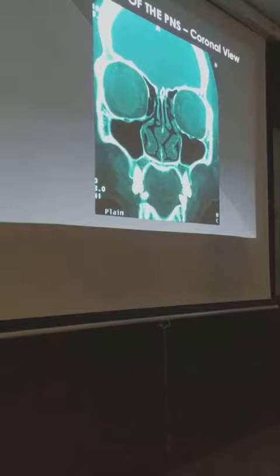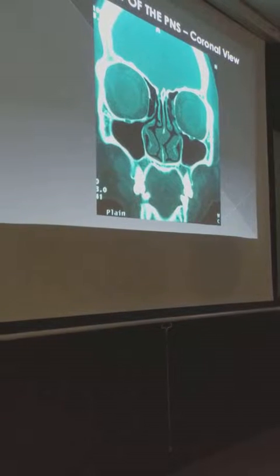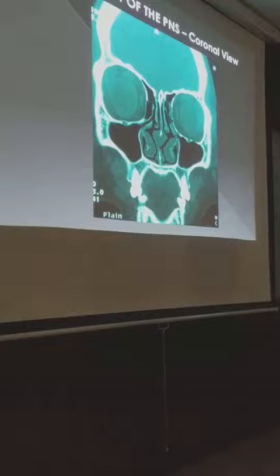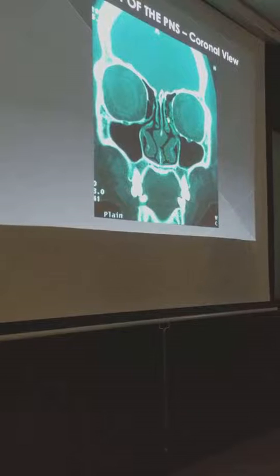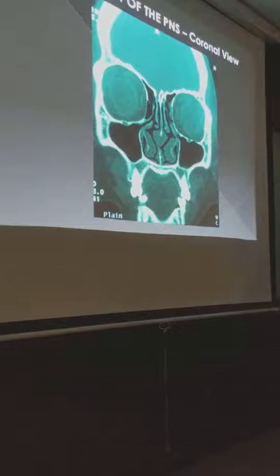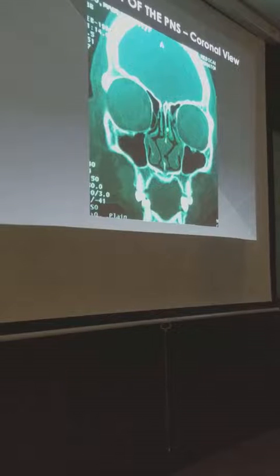Right? And like what I said, if you carry it all the way up, you probably will also open the inferomedial aspect of your agger nasi. Okay. Now, I forgot something about the agger nasi. Can you bring it back just briefly? You know, when you do your... that's why it's important to know the agger nasi.